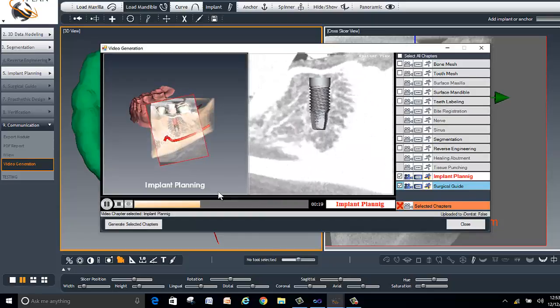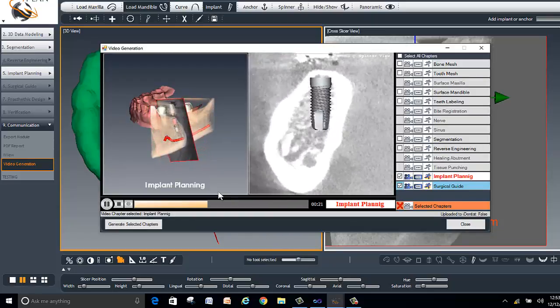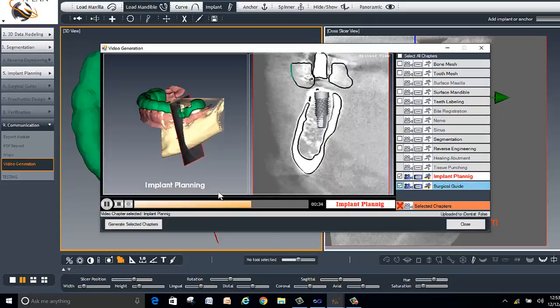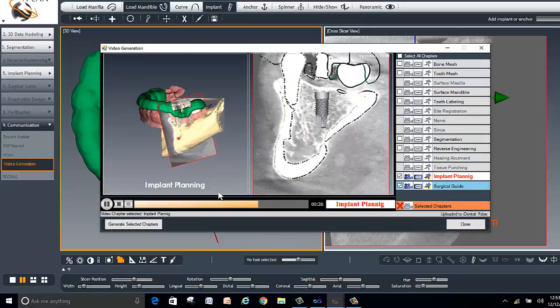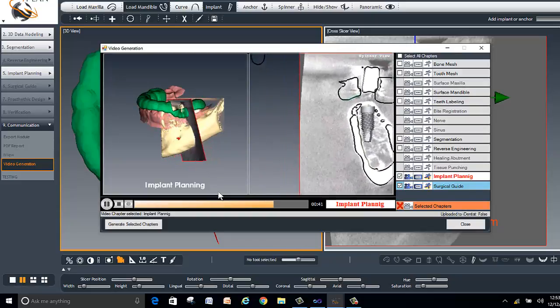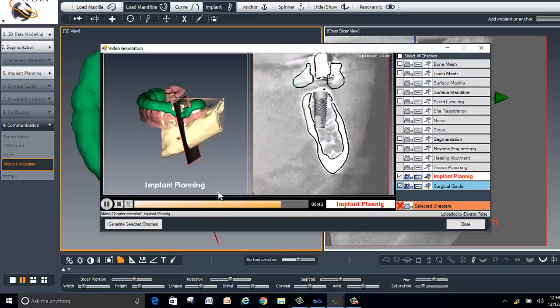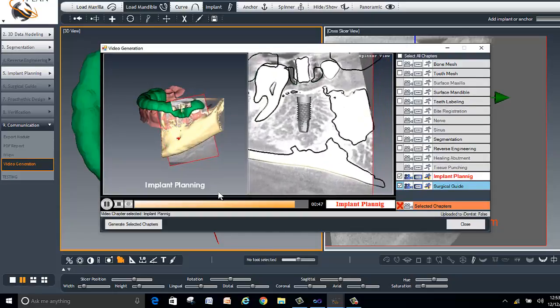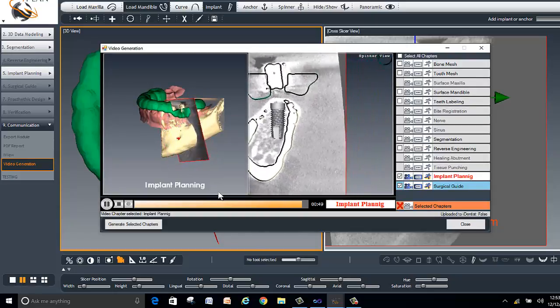We can select various chapters for presentation and include it for you in the actual treatment plan that we will put on demand in the iView in the cloud. So I will show you this in the final iView so you can review the whole thing. Here it's showing the bone that was added, and we have a 360-degree view of a spinner slice around to show where the implant is relative to the mesial distal buccolingual position of the bone in the mandible.